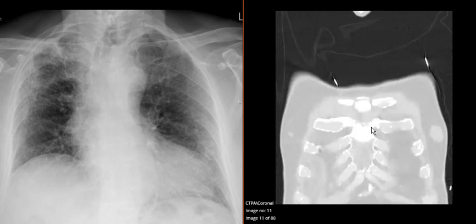So I'm going to use the coronal view of a CT scan, so slices in the coronal plane front to back, to illustrate some points on an X-ray that might help make anatomy more clear. So we've got the patient's clavicles. You can't quite see the spinous processes, but he doesn't look too rotated. But his trachea does do a little bend around what was the aorta.